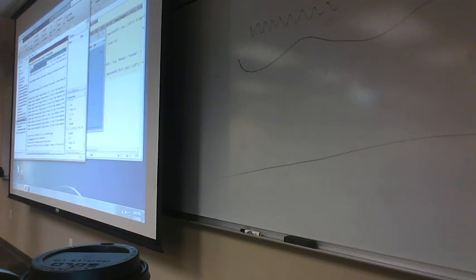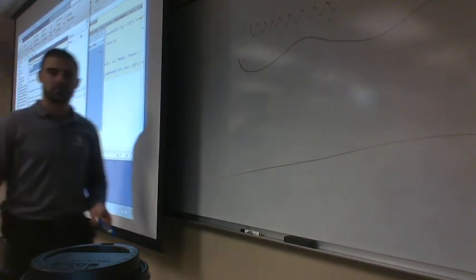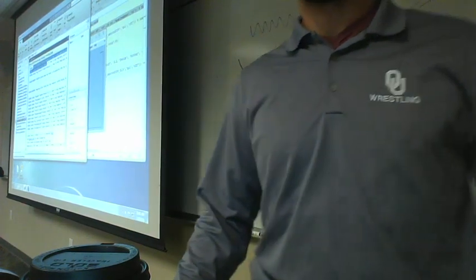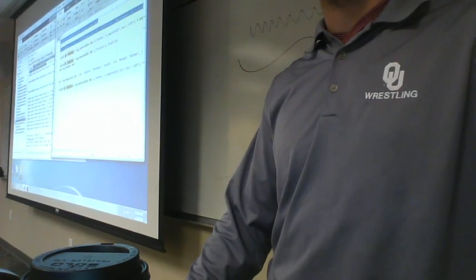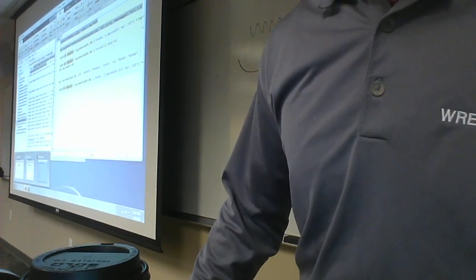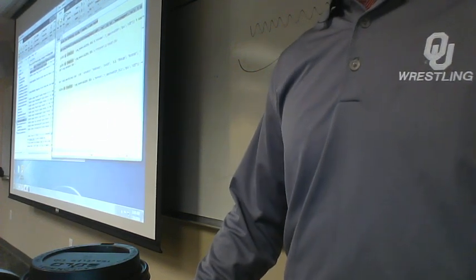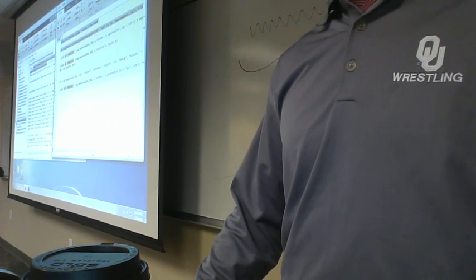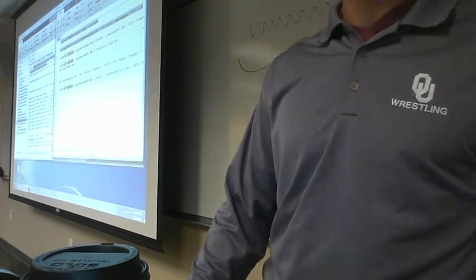So you'll have that, and now we'll work with the resampled data. Let's see here. This is actually still thinking on me. I'd like to move past this particular aspect, so I'm going to X out of that and come here.